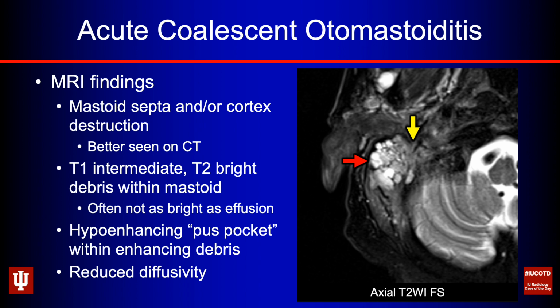Okay, so reduced diffusivity in the temporal bones is not always cholesteatoma. It is critical that you know the history of what's going on, because sometimes in the setting of infection, it can indicate an intramastoid abscess. But we've talked to, seems like I'm trashing MRI. I'm certainly not. MRI is extraordinarily valuable in assessing these patients because it is far superior to CT for looking for those complications. So these are complementary imaging modalities.